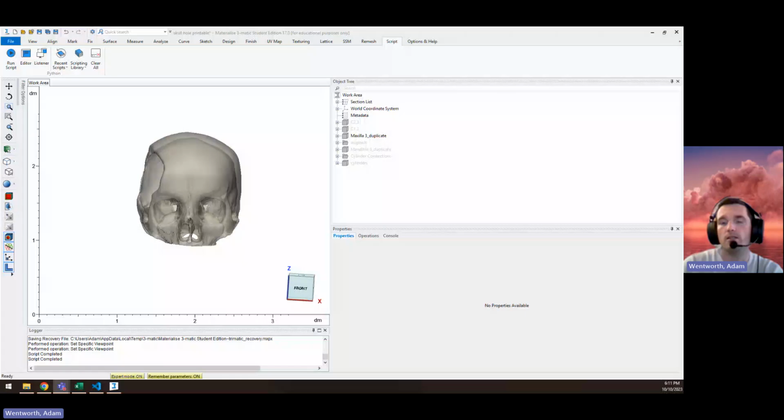My name's Adam, and this video is showing you how to write scripting to automate view orientations in 3-matic. Automating view orientations may seem kind of trivial or not needed, but it can really make a workflow more seamless in terms of the user interaction, by automating the view that the user needs to view certain parts or to make selections of certain objects a little bit easier.